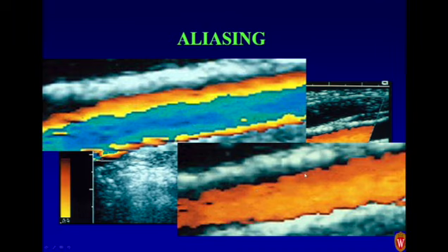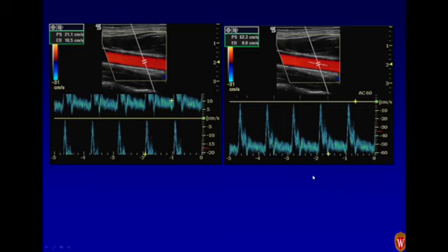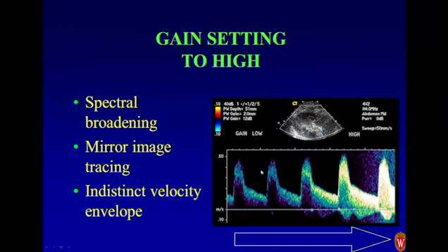Now, the take-home point is, if you are doing a carotid artery ultrasound and you are trying to characterize the vessel integrity, is there atheromatous disease? Let's live with the aliasing, and we will see a nicer interface between the flow in the vessel and the vessel wall. Remove the aliasing, but you're going to add a more coarse appearance to the vessel wall. In spectral Doppler aliasing, same thing. It's like you take some scissors, cut off the top of the tracing, and paste it from below. Change your baseline, change the scale, and you'll get rid of that artifact.